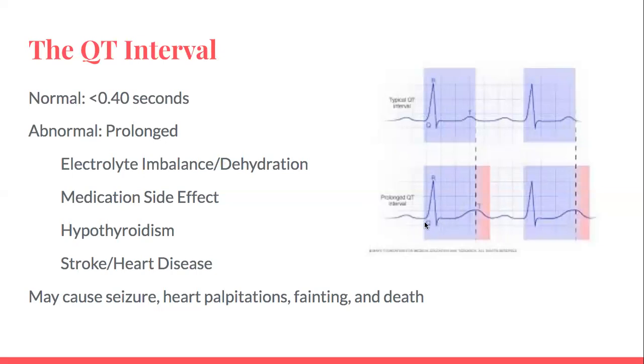So you can see here we have the start of the Q. This would be 0.4 seconds, but the T wave actually goes beyond it. So everything in the red here is that extended QT prolongation.